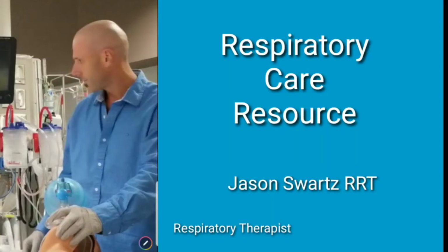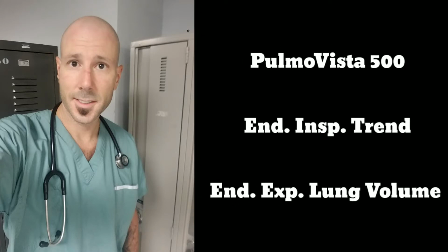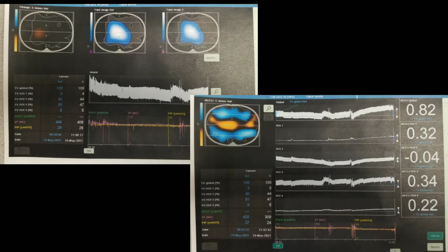So in this case study today, we're going to look at a patient that's on APRV, and we're in the weaning phase. So we're trying to wean the P high in this ventilator mode. I have some of the reports of the end expiratory lung impedance view that you can see on the PulmoVista 500, as well as end inspiratory trend. So we're going to be looking at the impedance values on end inspiration as well as end expiration.